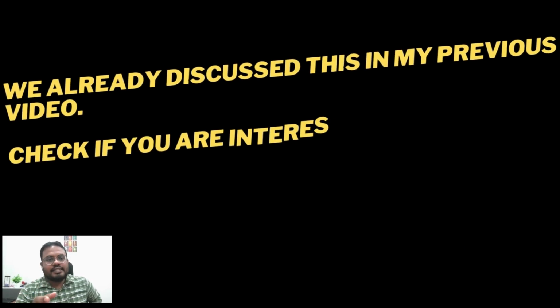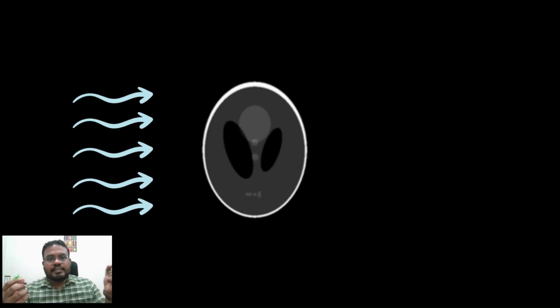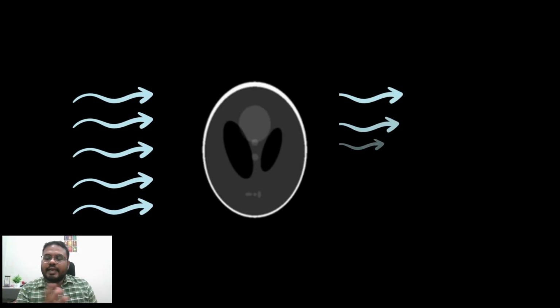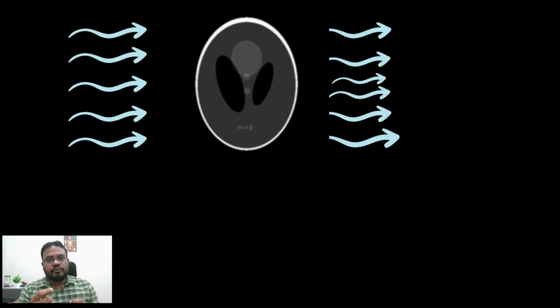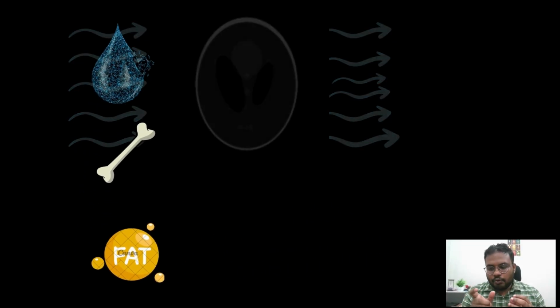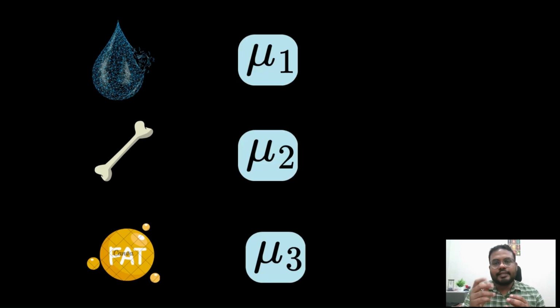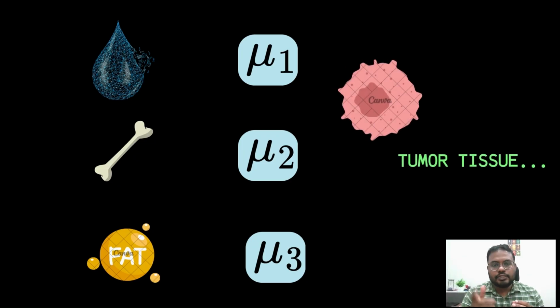Again, we already discussed this in my previous video. Practically, when hundreds of X-ray beams enter your body from one side and pass through, different tissues absorb them differently. For example, fat, bone, and water all attenuate X-rays at different rates depending upon their linear attenuation coefficient. So we simulate this using the linear attenuation coefficients of water, bone, fat, and even tumor tissues.